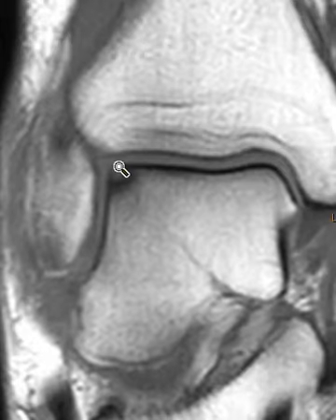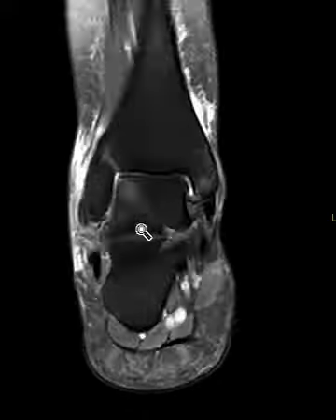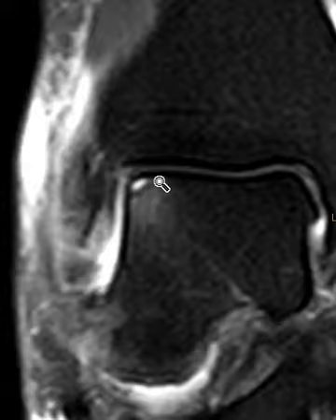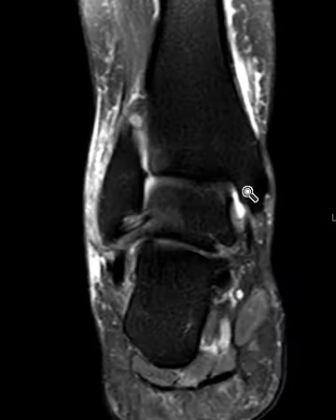It involves the articular surface. There's no loosening, no displacement. We can see that in another view here. And in this one you can see that there's some bright signal beneath the articular cortex there and a halo of edema, but just a small osteochondral defect. These are very common. They can cause pain and cause an ankle joint effusion.